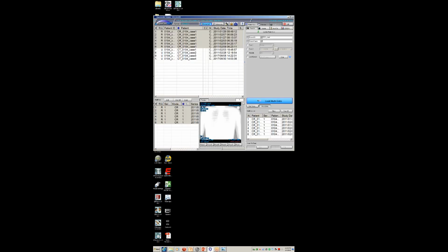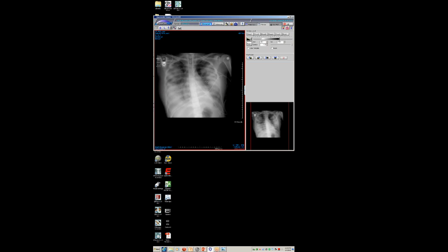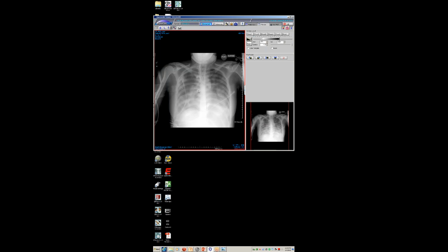Go back, sorry. This is literally 16 hours later. She develops pronounced consolidation peripherally. She's intubated. You can see the date is actually, I think, 12 hours later, not looking very good. She continues to progress and get worse and worse. Here she is in diffuse consolidation, and they were giving her a presumptive diagnosis of some viral illness with development of ARDS.